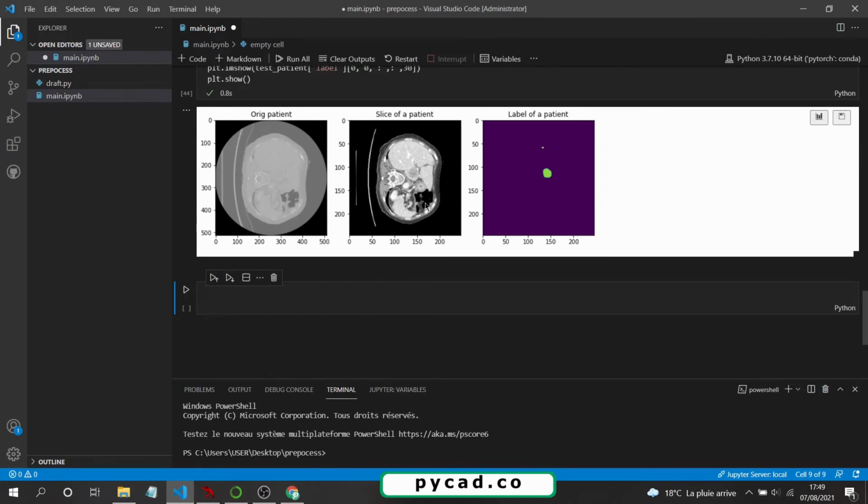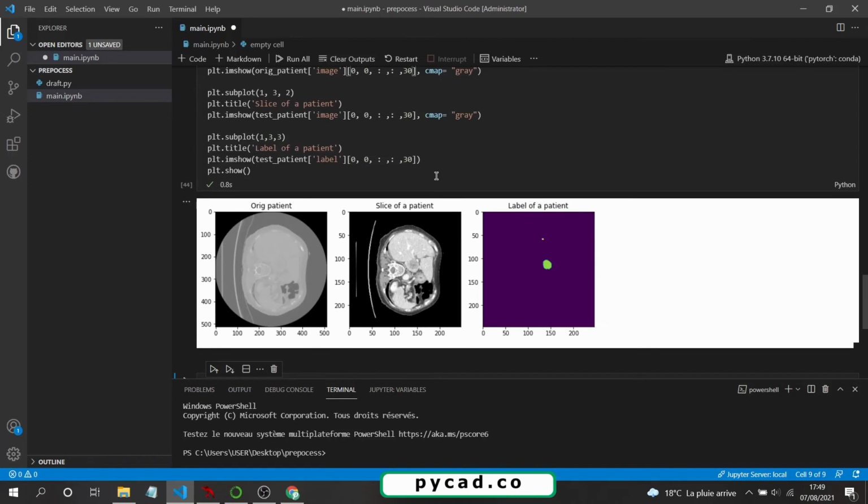There is another transformation that I will tell you about, and it will be the last, and sorry about this long video. This transformation is to help you, because you can see that all this black area, we don't need it. So you can use some mathematics like NumPy or PyTorch to do this manually with a for loop or something.